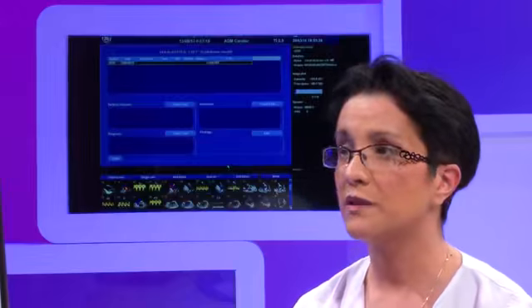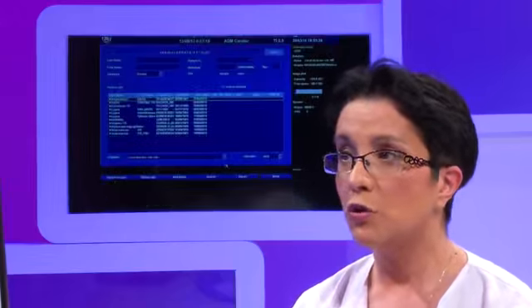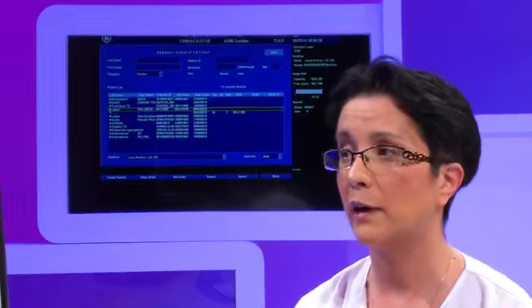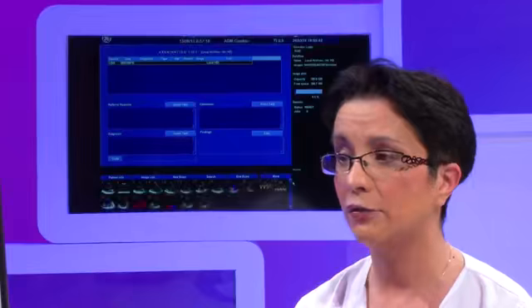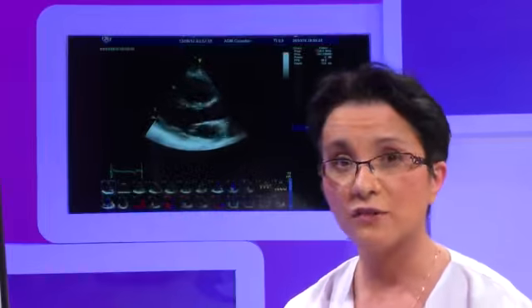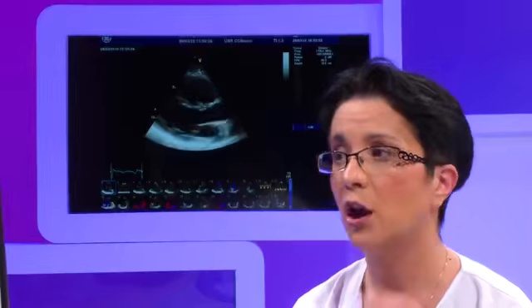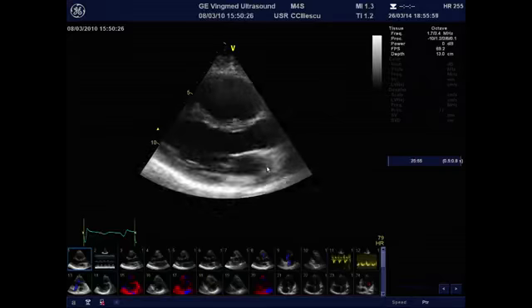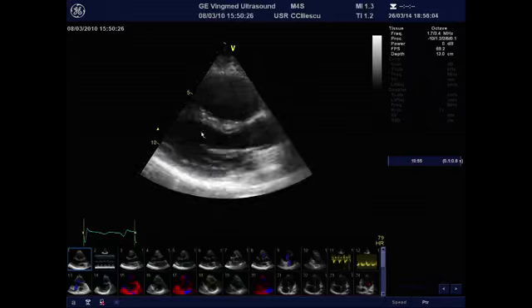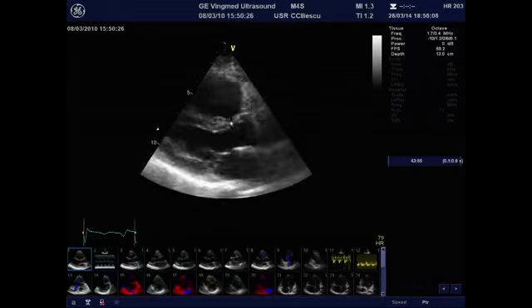Now, going to lupus. Lupus, systemic lupus erythematosus, as it is correctly and completely known by rheumatologists, is an autoimmune disease which can involve different organs, from which the heart and the lungs again can be involved. And here is the case of a 25-year-old woman who was addressed to our department for dyspnea, which was installed for several months now. From the first images, we can see that the impression is of a normal dimensions left ventricle, but an enlarged right ventricle.